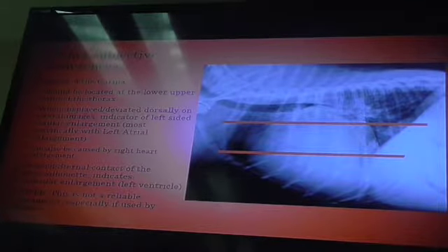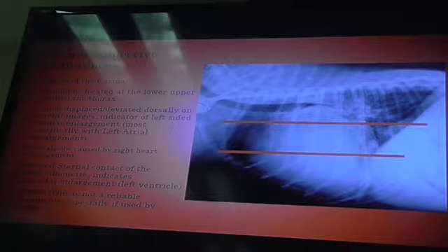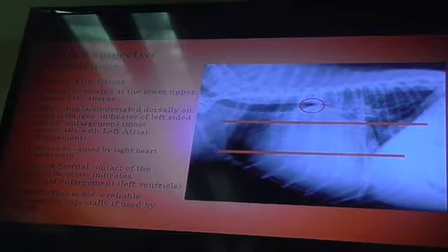You're usually going to see it with the loss of caudal cardiac waist. Left atrium. Let me see, 1, 2, say it one more time. Loss of caudal cardiac waist and elevation of the carina. Your main differential is left atrial disease. So that's the carina.